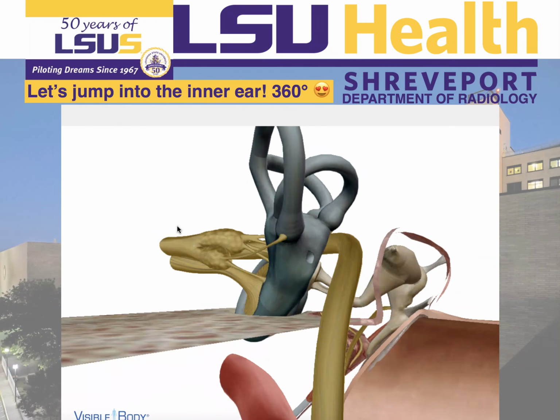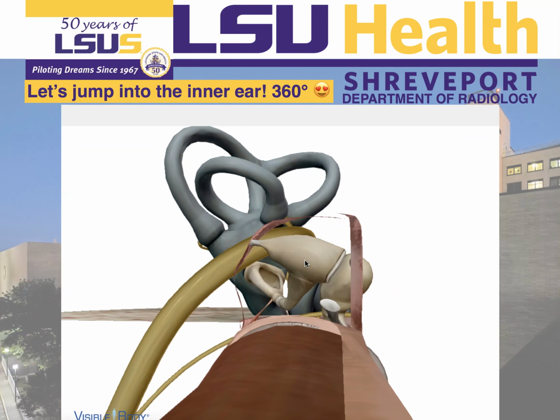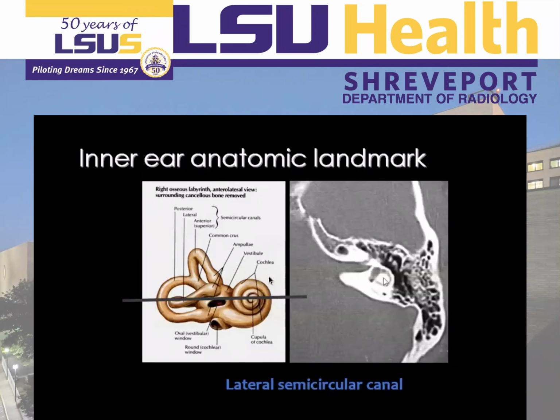Okay, this is also the inner ear. Here you can see the round window, and here you can see the stapes from the middle ear attaching to the oval window in the vestibule. Here a little bit bigger, the vestibule. Okay.